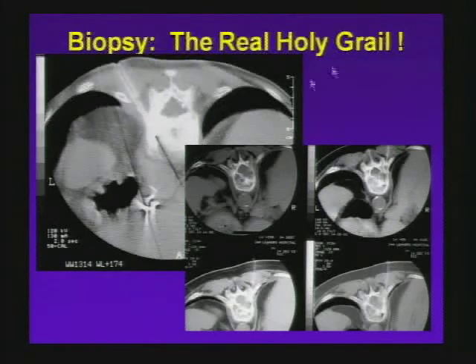And a couple of points about biopsy. This is around T11, T12. There was a concern about going in and getting a pneumothorax. So what we did is we injected 50 cc's of saline into the extrapleural fat, and we created a window so we could get in without having a pneumothorax. You always want to go for an area that looks abnormal, where you don't want to go here where there's normal trabecula. You want to go into the more sclerotic, lytic area to get your diagnosis.